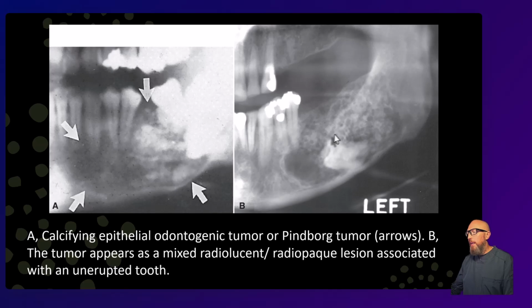And then this one I like. This is what I was just talking about. This does look multilocular. It looks like you have these small loculations. This is that honeycombed appearance. And if I saw this, I might be worried about hemangioma. Usually they don't grow this big though. But you might have both of those on the differential because of the honeycombed appearance. But this being an older gentleman, posterior mandible, I think first thing that should come to mind probably is CEOT.